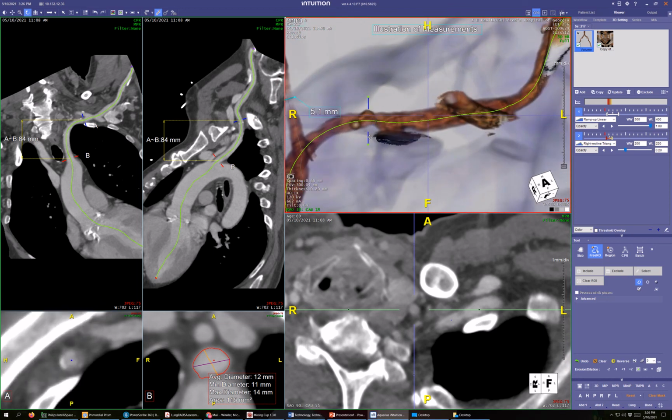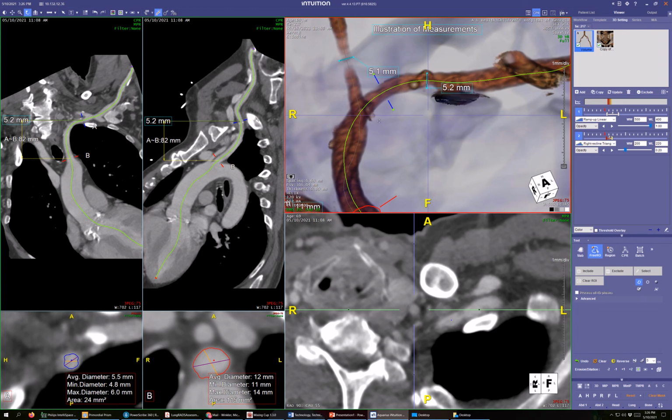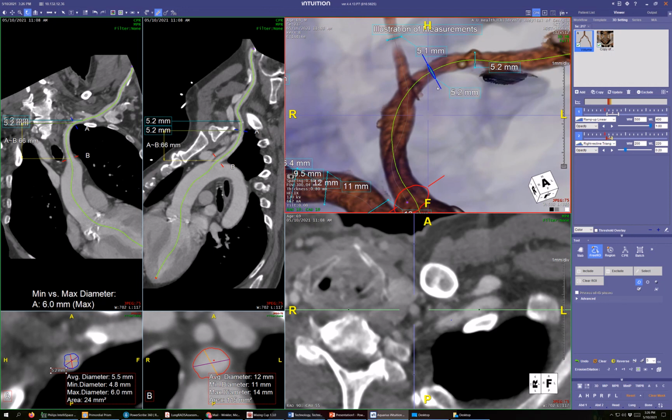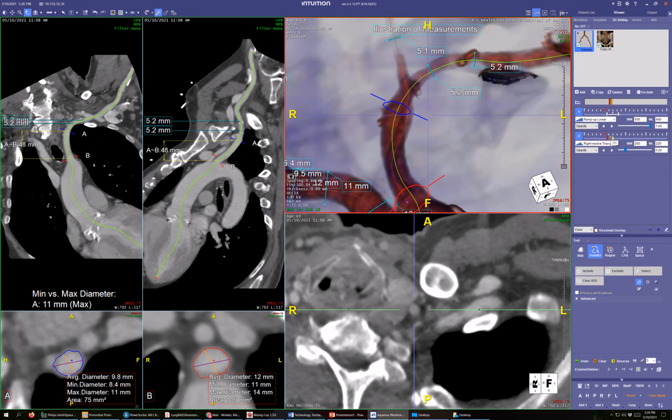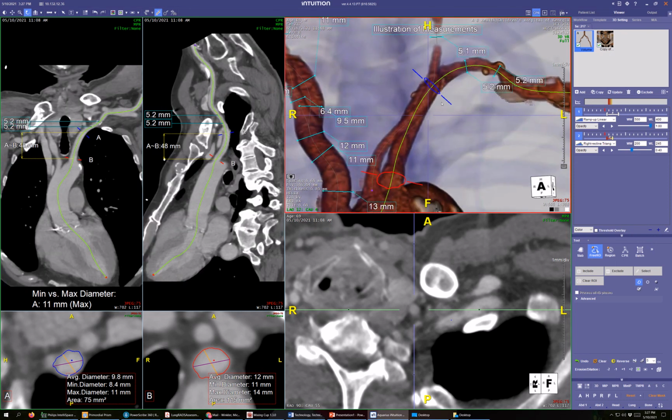Here's a little narrow spot. All right. Yeah, look. And that one, why does it look so see-through? Is that just because there's low flow through, or not as much? Oh, it's all dependent on what we do with the pseudocolor. I see, it's not real color. The pseudocolor is still about baseline density, right? Like the Hounsfield units. It's based on it, but I can manipulate it quite a bit. So there's... we'll do this for mid here.